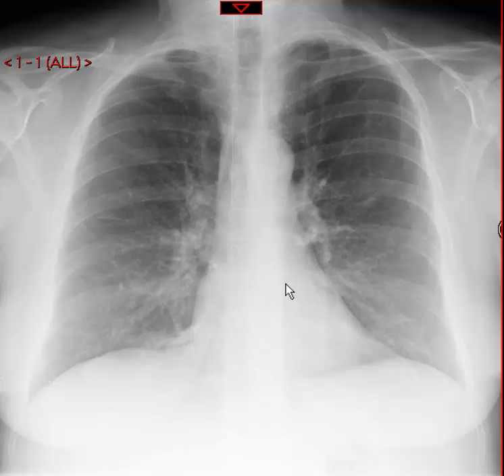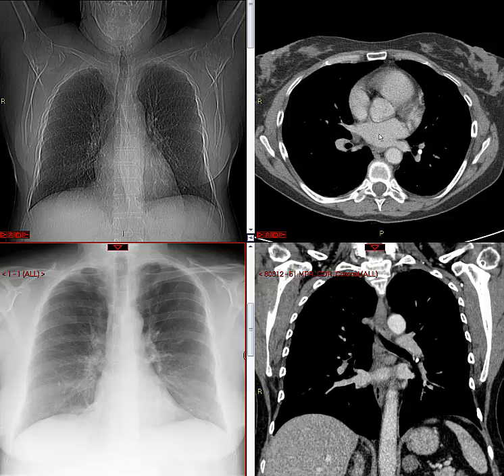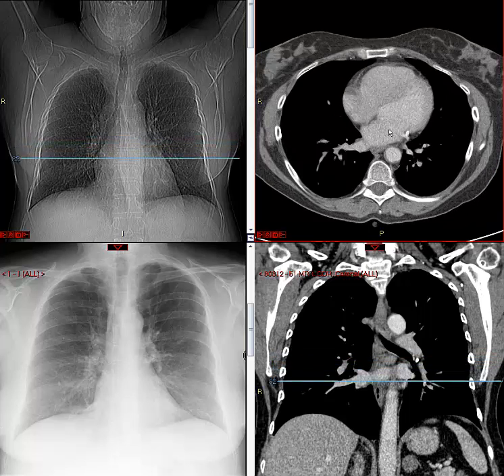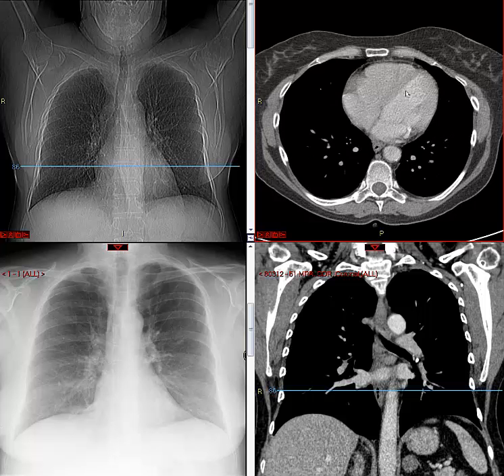And it's superimposed on the frontal view, you don't really see it. From the left atrium, oh, here's the left auricle, interesting to see. On the frontal view, it's supposed to be right, this little hump right here, but it's very difficult to see on a chest x-ray. Okay, so as blood leaves the atrium, then it'll go through the mitral valve, which is right here, and come into the left ventricle. So here's left ventricle.